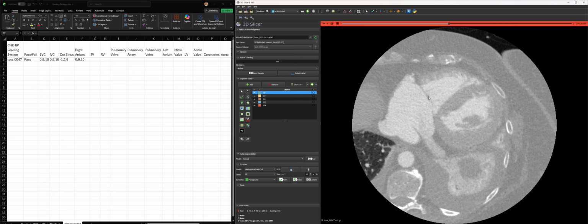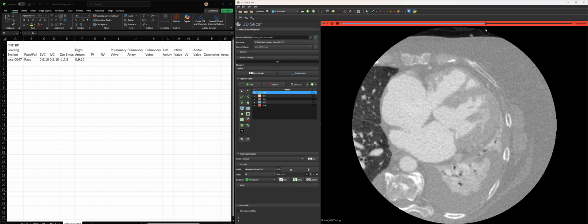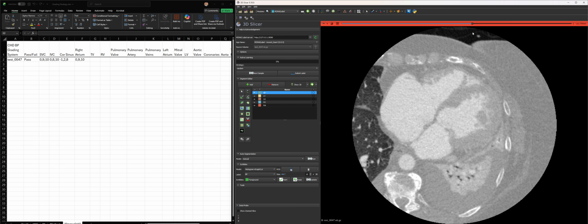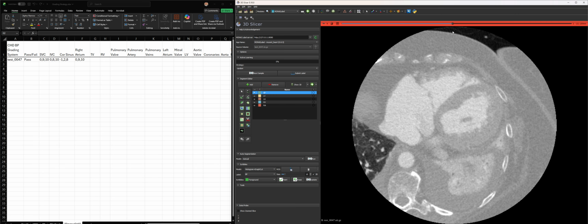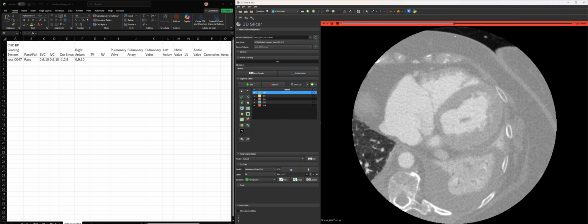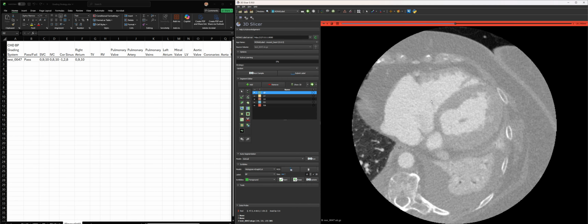But right here, I've got quite a bit of tricuspid valve. So my potential, this is a very good tricuspid valve, which we usually don't see. That shunting helps to maintain contrast evenly distributed throughout the heart. I'm going to give this probably a 6 tricuspid valve.